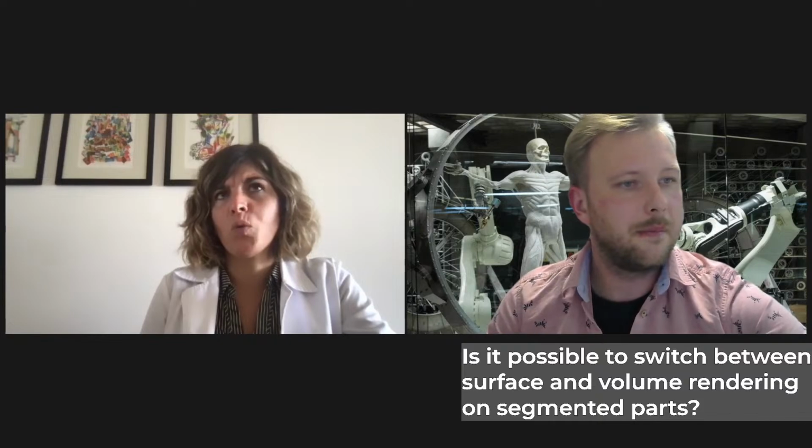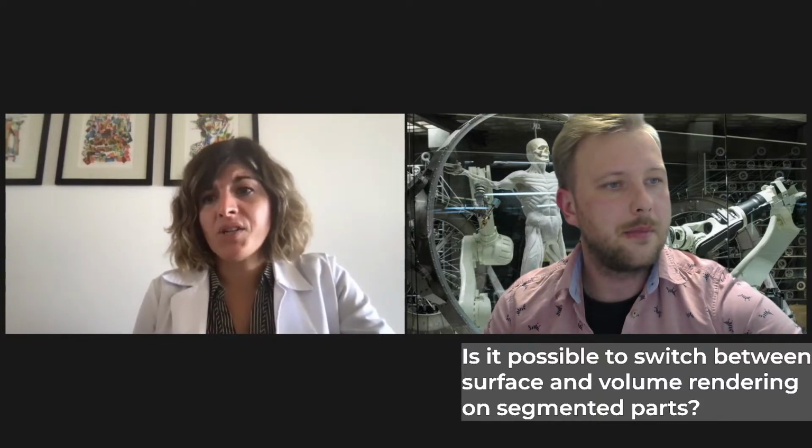I'm not sure what that means, because when we talk about surface, it's the mesh that we were talking about, our third step. Remember that you have all the volume from your CT data as base volume, which was the 3D view we were seeing at the beginning. It's not a model, it's just a 3D view of every structure that is part of the CT, like muscles and soft tissue. But then we go to the mask, and from the mask we create a mesh, and that mesh is a surface. So you are talking about a very different object there.